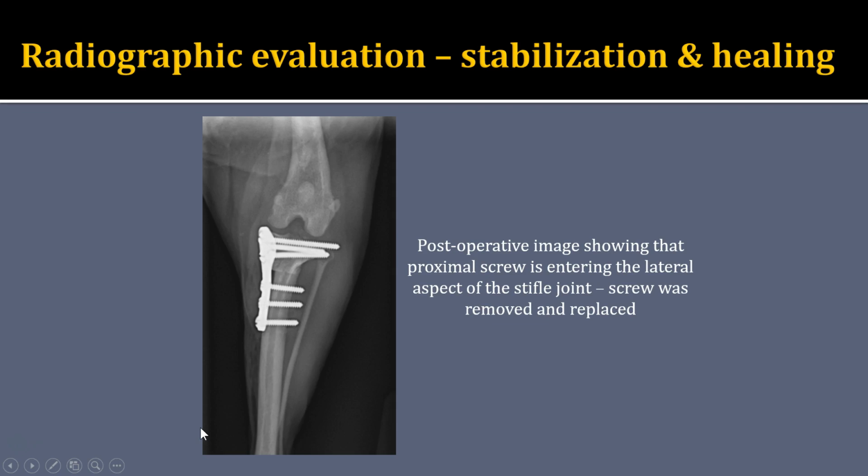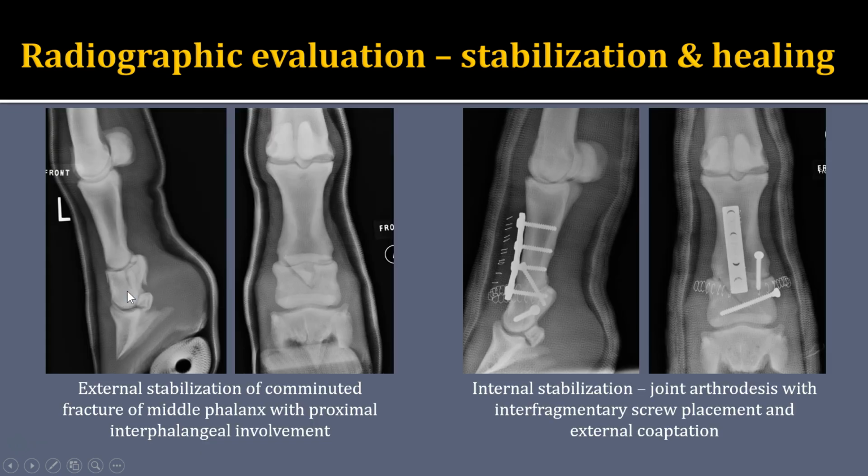Here's a cranial caudal view of a patient that had a tibial plateau leveling osteotomy, and this is a radiograph that was obtained immediately postoperatively. This is just an example of why you would want to have an immediate postoperative or post-stabilization set of radiographs, because it was identified that this screw is actually partially into that stifle joint, and so they went back, removed that screw, and replaced it more appropriately with a different screw.